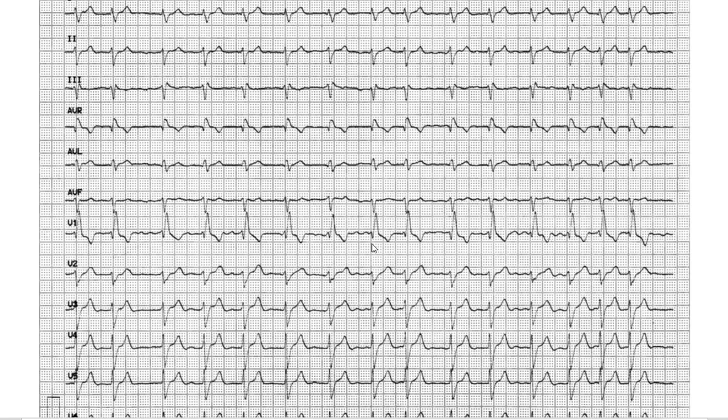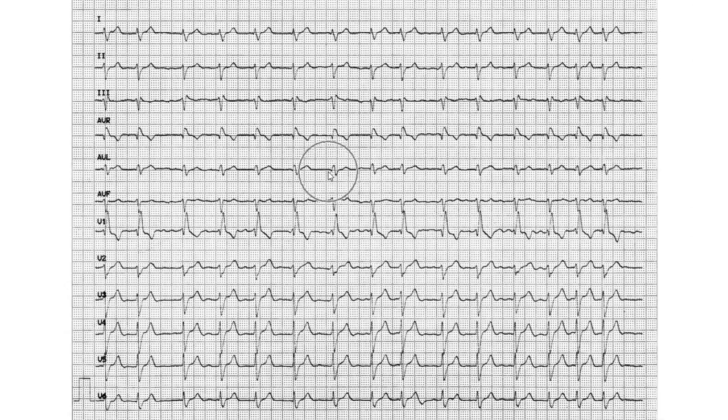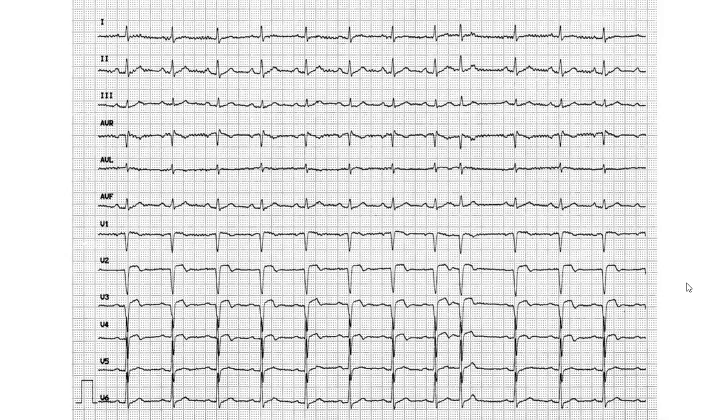Okay, fibrillation. Check the heart rate, then check the frequency of this. You find that it is basically about 1, 2, 3, 3.5. So your rate is between 400 and 500. Pick a number in the middle. Okay, now we're done with that question.